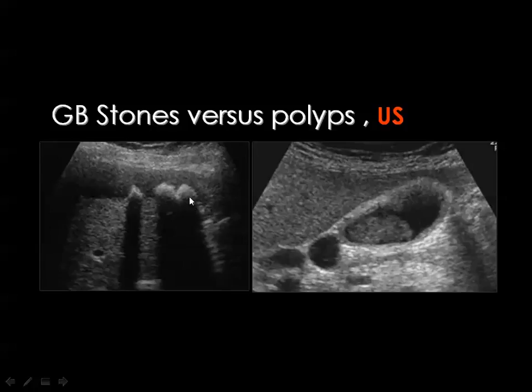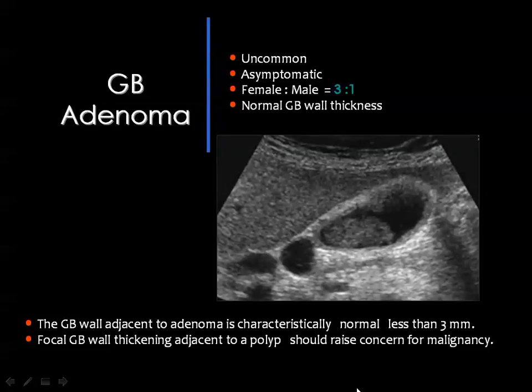You see, calculi are mobile, the polyps are not. Calculi will show typical posterior acoustic shadowing, and the polyps do not show this shadowing.